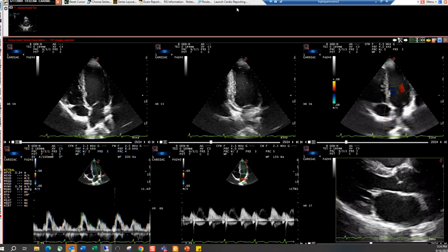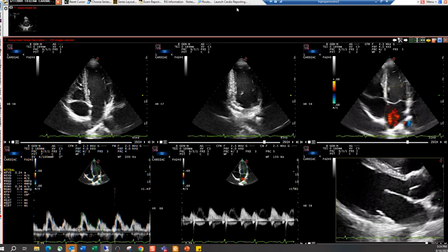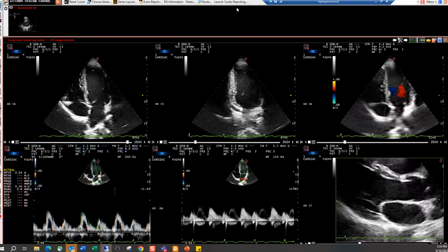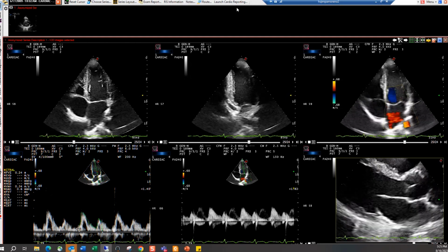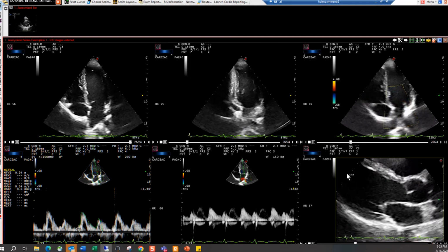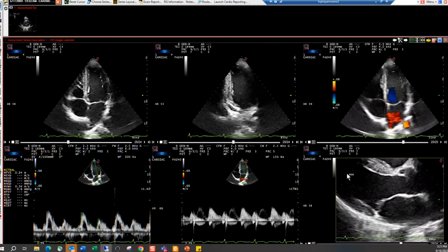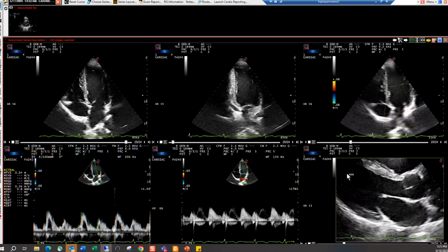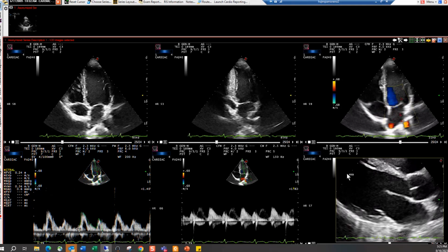And so that button launches the reporting component and therefore transfers all the demographic information, all of the measurements that were performed on the report, and then allows for interaction. Tony showed a little bit about remeasurement. It's even possible to click on a specific measurement in the report engine and cue NovaRad to redo that measurement on a specific frame. So highly linked together so that it will be a single workflow for all of the different participants.